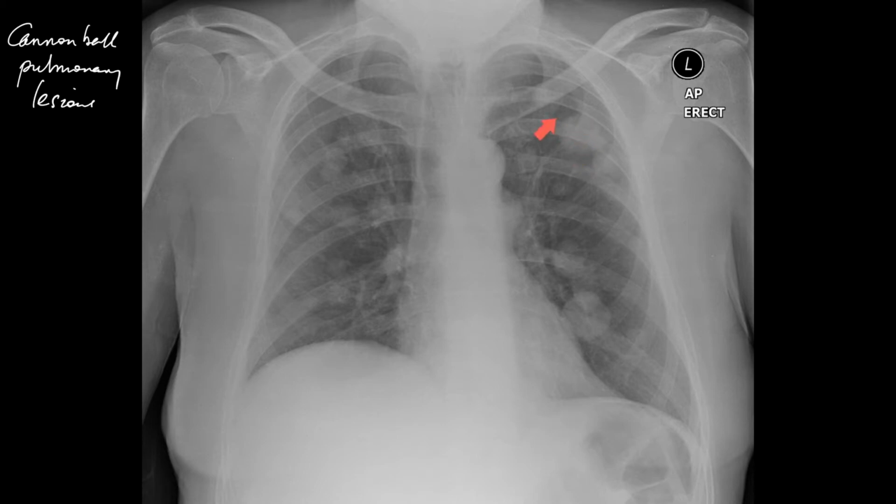But because they lie within the diamond, I know that the diamond is devoid of bone, and so these are likely to be lung or skin lesions. Now, if they were skin lesions, it is likely that because they are multiple, the skin lesions will be present elsewhere other than just the lung fields.